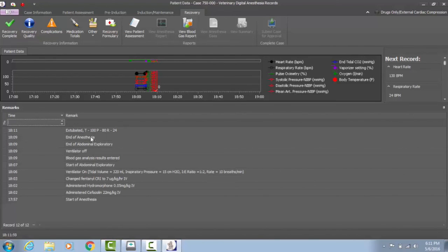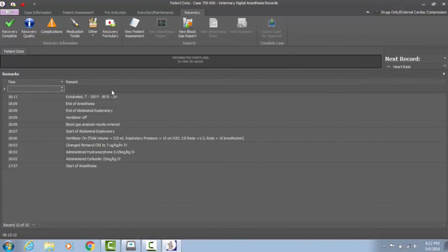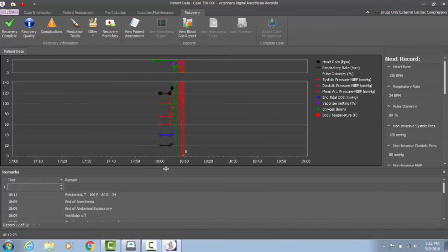Sometimes your remarks might disappear, so just make sure that while you're monitoring, your remarks are actually showing up. As you've seen me do, you can drag this up and down so you can see your remarks better. Sometimes if you don't click enter and you just click off the line, it will disappear. So make sure that all your remarks have gotten entered and that you keep up with that. We do have little notepads, so when a case gets pretty intense, you can copy down the drugs given and then catch up on the computer at a later time.